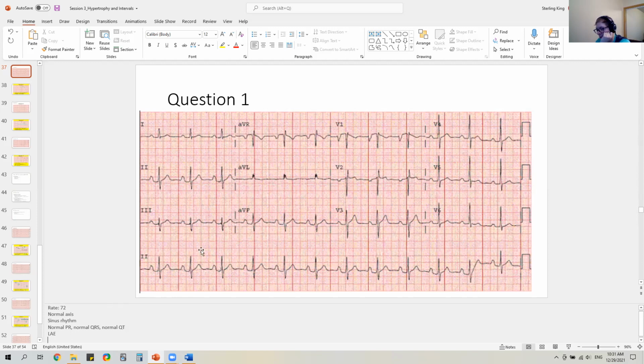And so I'm done with the atria. So let's look at the ventricles. Looking at the ventricles, the left ventricle is really easy to see. If I look at V6 and count, 1, 2, 3 boxes, and I went with, let's say, V2 here, 1, 2.5. So that'd be 5.5, and the criteria is 7. So that's not enough. So I don't think it's left ventricular hypertrophy.